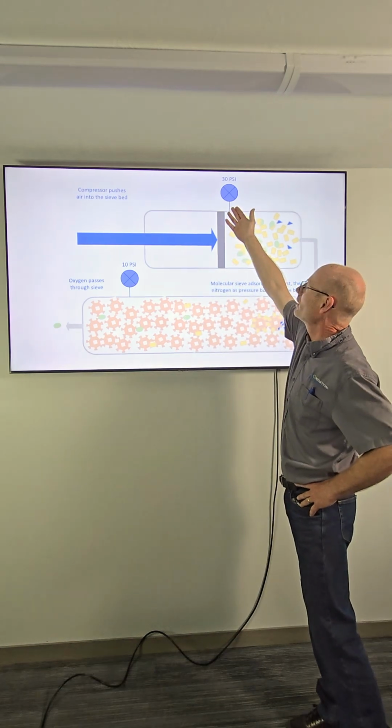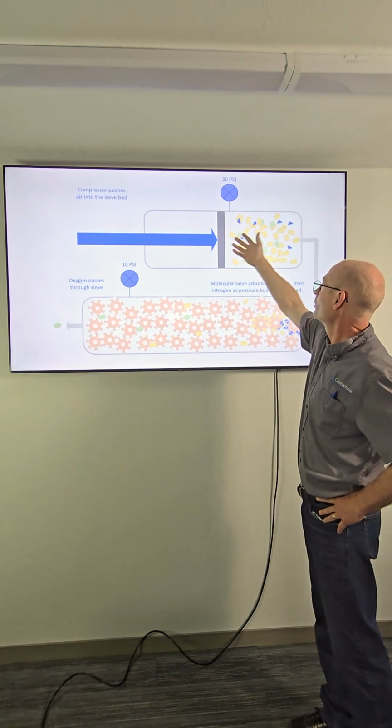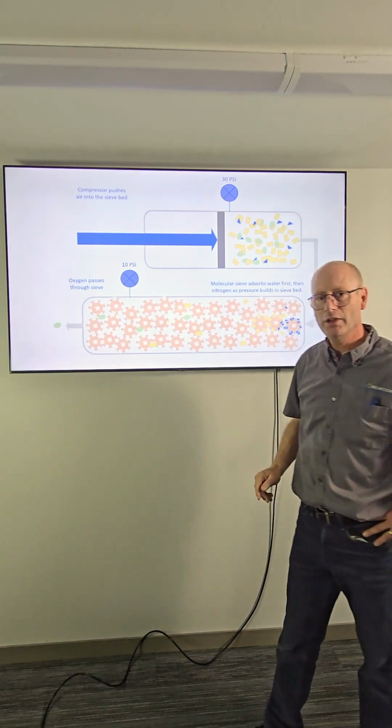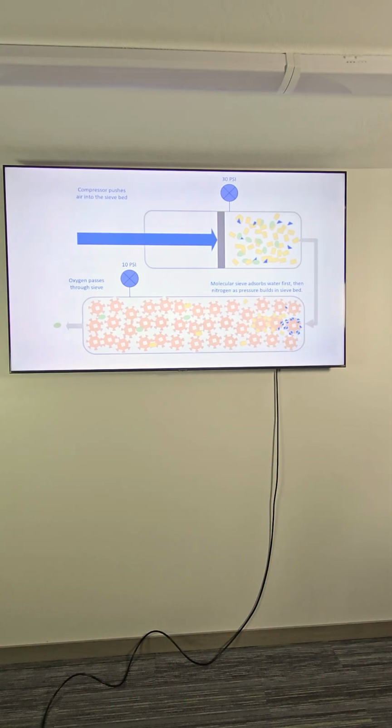So now I'm representing, we've got about 30 psi of pressure pushing in here. By the time it gets through, maybe we're up to 10 psi in the sieve bed.